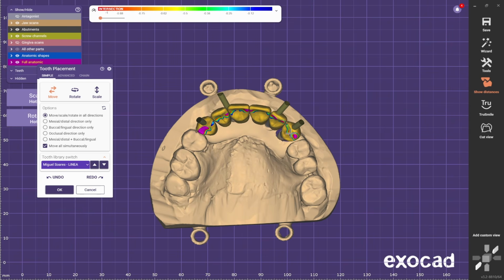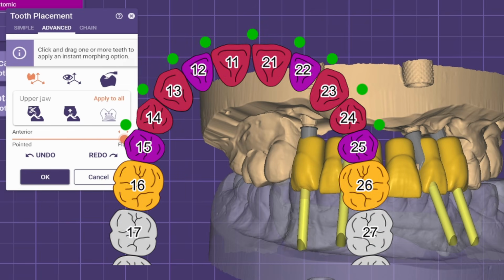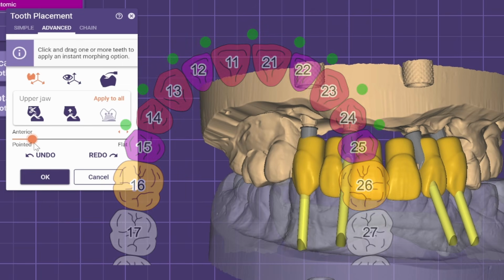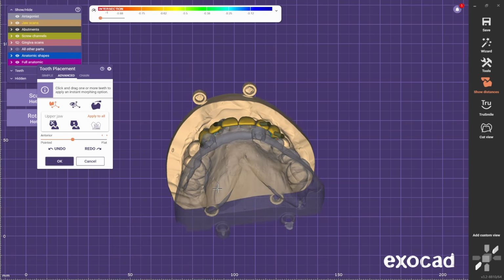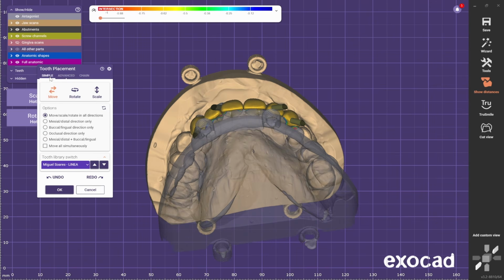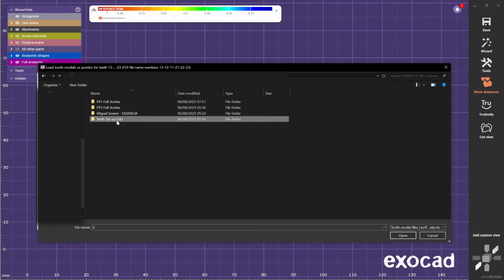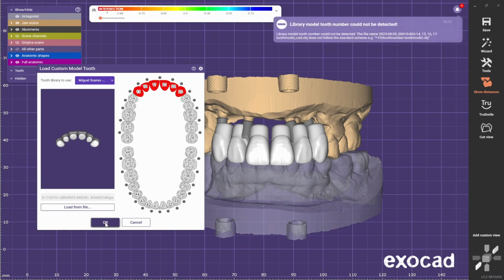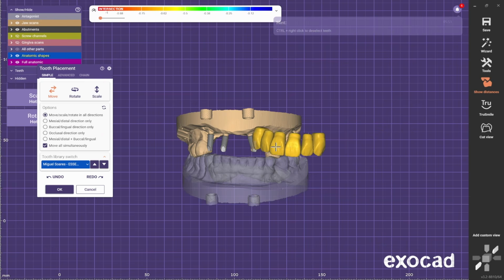I find that usually this misplacement happens when you have a mixture of Pontics and retainers. So every time you have a case like that, probably it's better just to bring up a previously set up library like we did in this case. This is especially useful to do full arches. You already have everything in occlusion, everything in the correct placement, so it's an amazing technique.